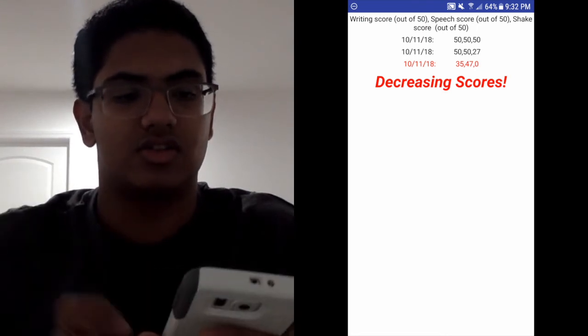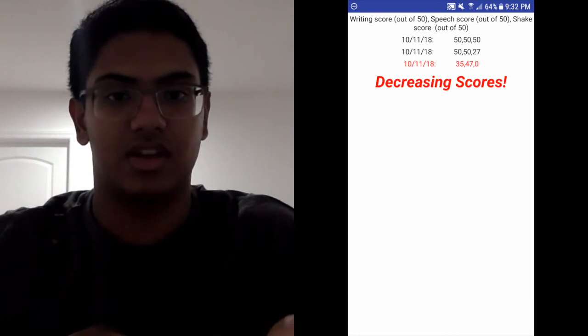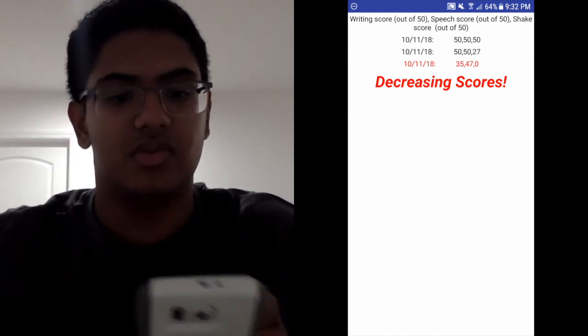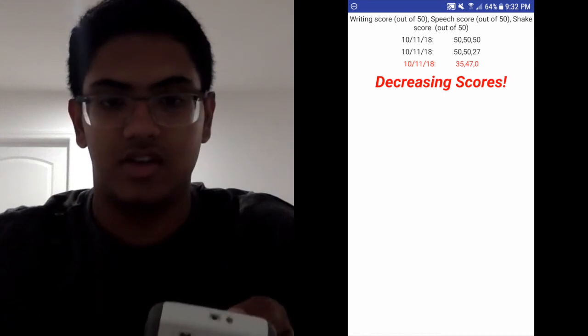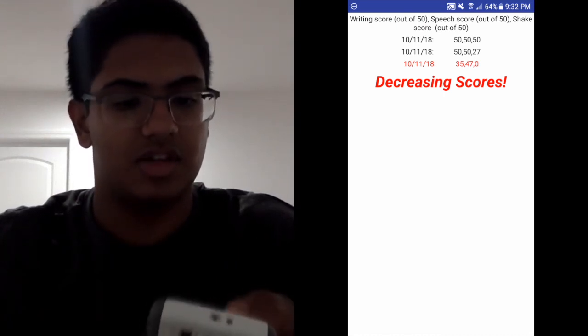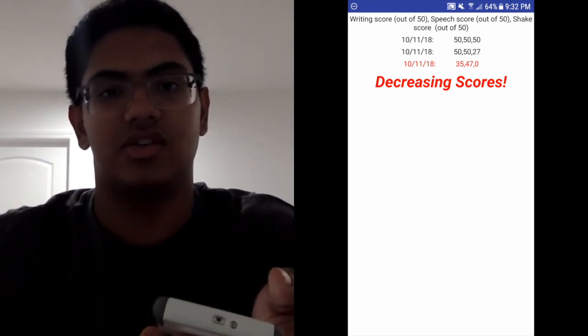So as you can see, there are the scores on the screen, and I did pretty good on the first two, and I got a 0 on the last test because I was shaking a lot. And as you can see, it also says that my scores were decreasing because the two I did before the video were the baseline, and the score got worse the third time, which means that my symptoms are progressively getting worse, which means I have a higher risk of a neurodegenerative disease.